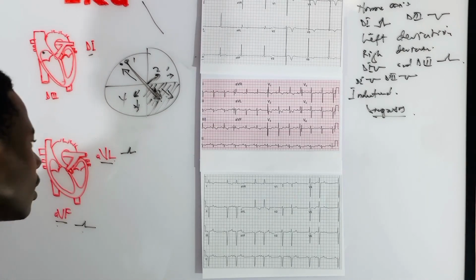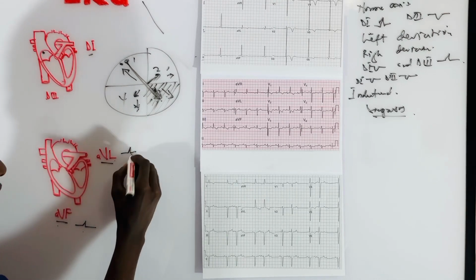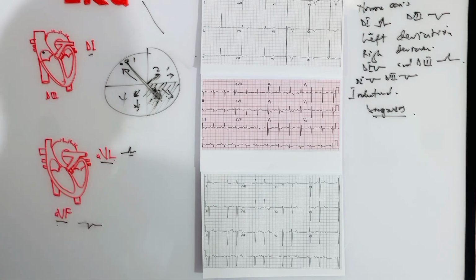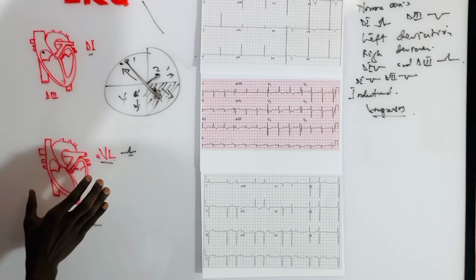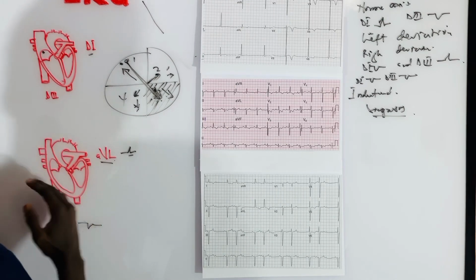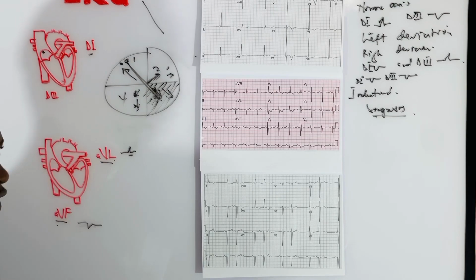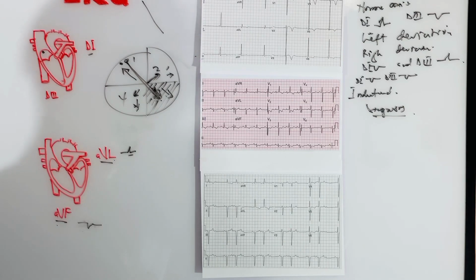Do you understand? Now, in the condition in which this one is positive, but this one changes to negative, the heart will be shifted. It means the heart has been shifted towards the AVL. Do you understand? Making something like a horizontal. Are you clear with it?